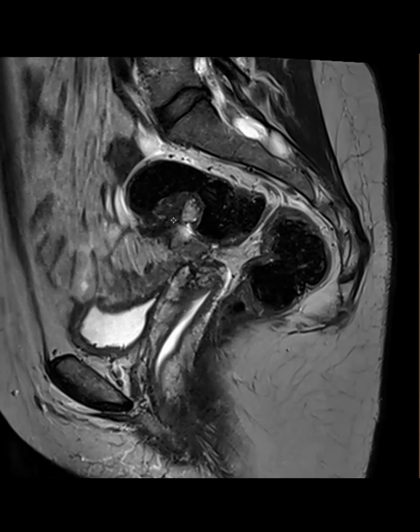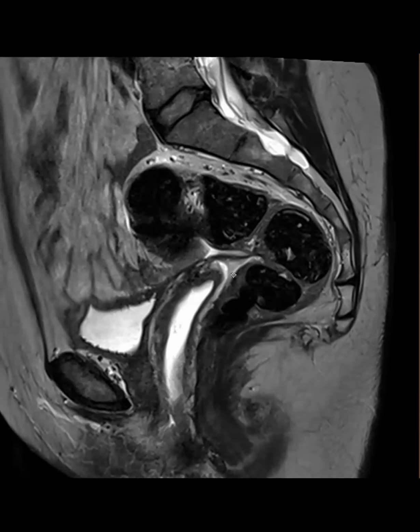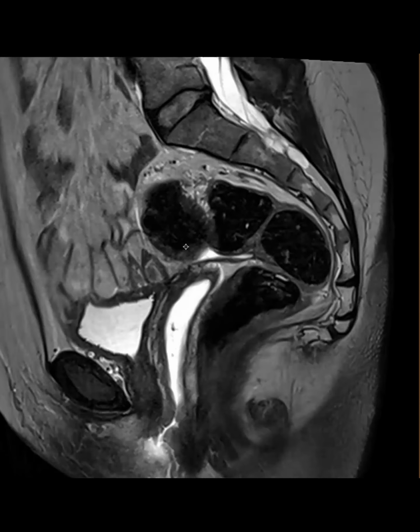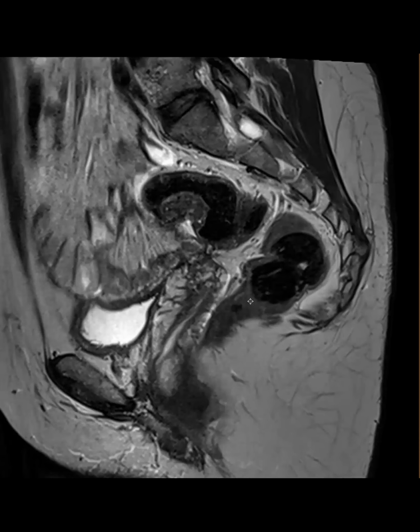And then we describe the depth of invasion. If it's superficial, it's the outer serosa, they just scoop it out. If it's deep invasion, then they do a segmental resection, and colorectal surgery gets involved. So circumference and depth of invasion. Okay. So this one was too deep. And there's two sites, which was important to know in advance, so that they get both, and it was confirmed surgically. It looked almost like it was tethered to the vaginal apex, but they didn't have to do anything over there.